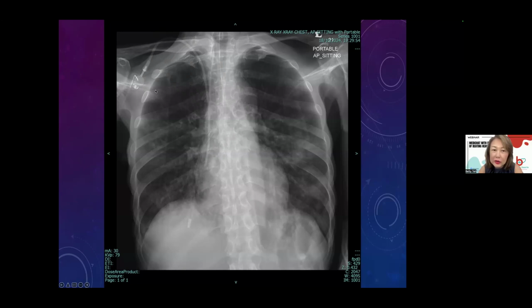Okay? Wow, this one I cannot. Oh, wow. Okay. Well done. But this is a very nice X-ray. I must keep it.